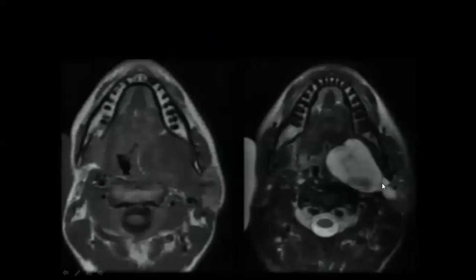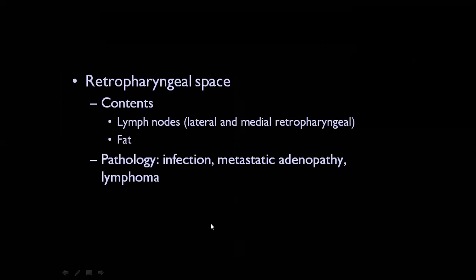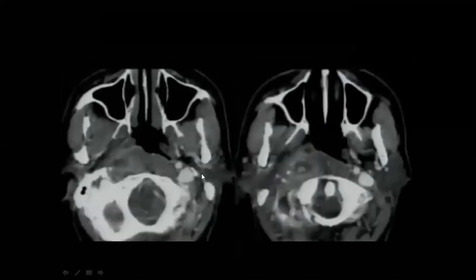Again, another similar case, extending through the deep lobe of the parotid. So pleomorphic adenoma. In the parotid, we mentioned before that it doesn't give one diagnosis. You should put differentials, because in the parotid you cannot know exactly what it could be until you take a biopsy or you remove it. So this is important.